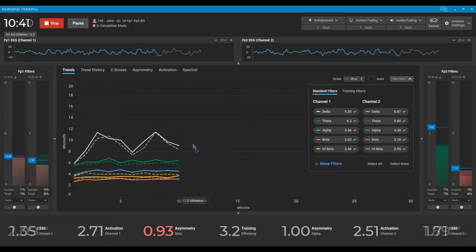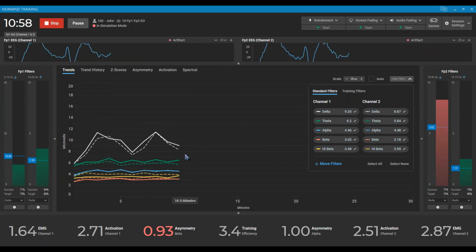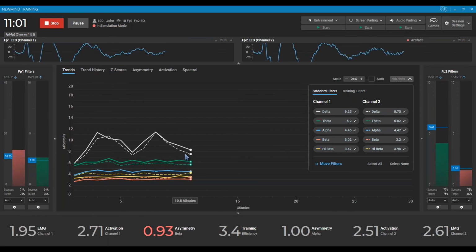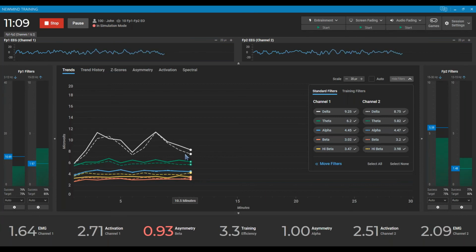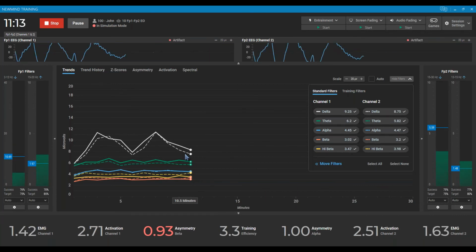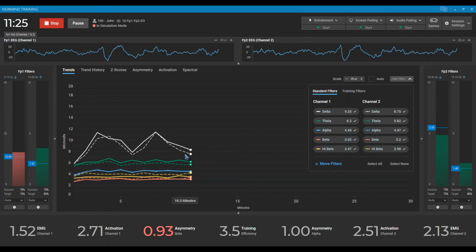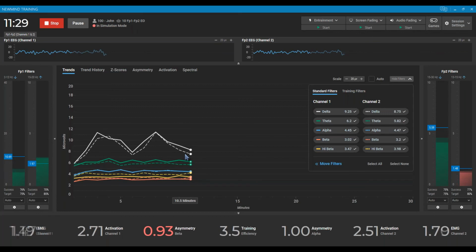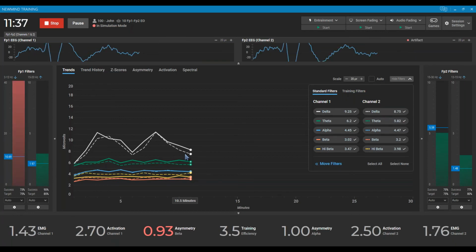I didn't have the success percentage really to tell me, but I could see in his trend lines that things were moving in the right direction. Now, I did check in with him on his next appointment, and I made sure that he wasn't mentally wiped out for more than about 30 to 60 minutes after the session, which he wasn't. He said he felt great when he got home. He wasn't tired. He wasn't mentally fatigued. So we trained him there, and he trained beautifully. And we actually got him through neurofeedback a little quicker, in my opinion, than what we would have if I left him up at 85%. I think Dr. Suter mentioned this before, his brain was more in that peak performer realm. It needed to be pushed. It wanted to be pushed. And his trend lines definitely showed that.